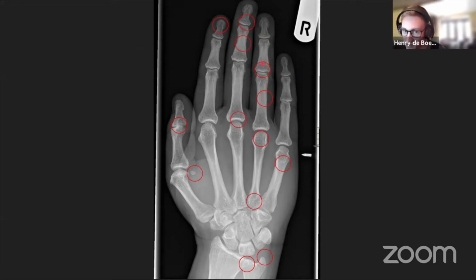And then describing the joints, so there's a proximal interphalangeal joint, so the first joint between the 2 phalanges, and a distal interphalangeal joint. So the answer here, I think we've done that one, yeah, right ring finger proximal interphalangeal joint.